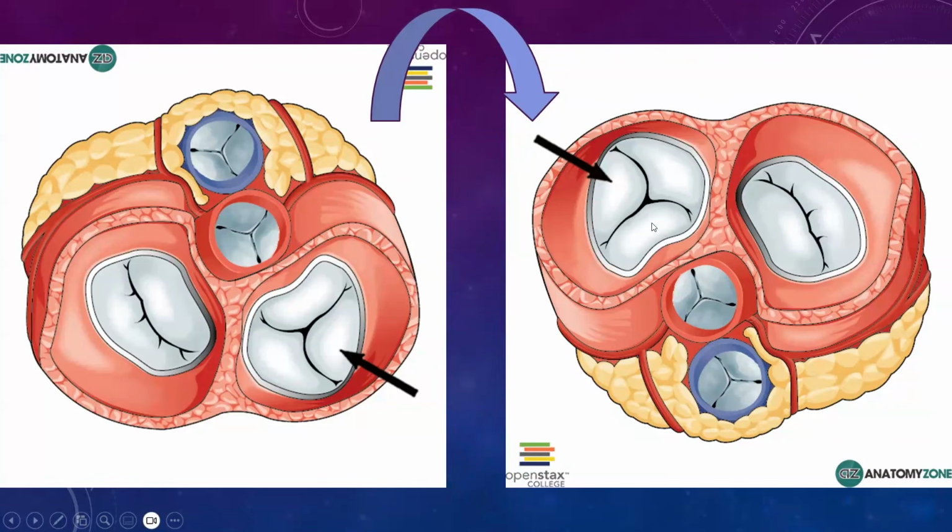And so although some sites will use this type of view, the one on the left, where the aortic valve is at 12 o'clock or sort of 11 o'clock for their procedures as well as their orientation, at our site we typically will reorient our imaging into the picture on the right, which is more in keeping with what we see on the transgastric views and to be more consistent. And as well in our interventional lab, we also do this in order to make sure everyone's speaking the same language and seeing the same pictures.